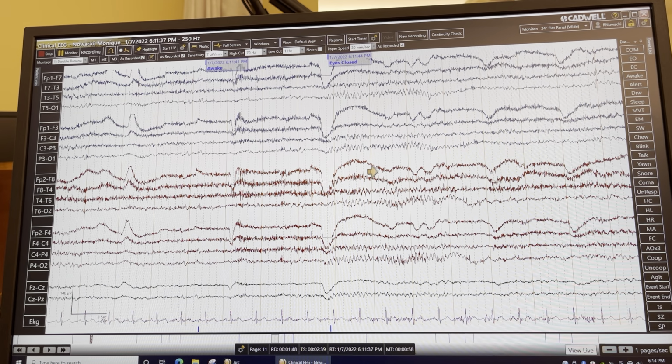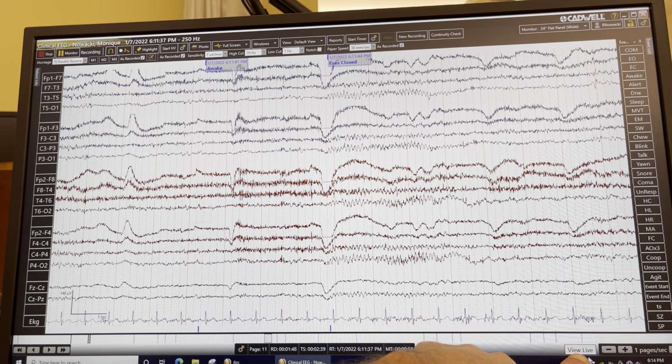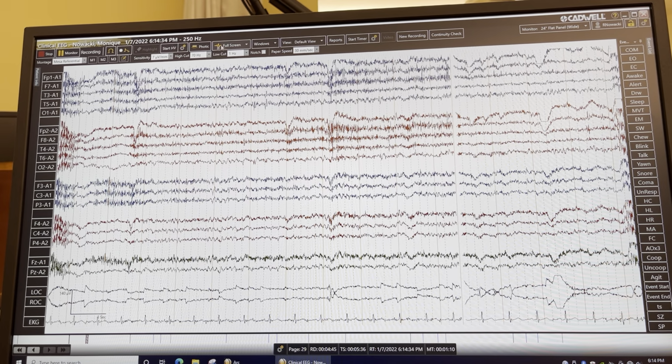Okay. Now this is review mode now, right? So to get back to view live, you click down here, view live, right here, and then it'll go back to the live recording. Okay.